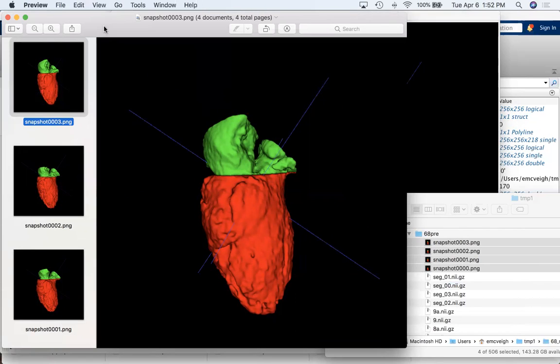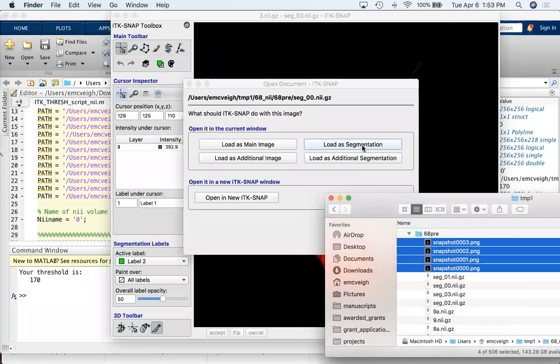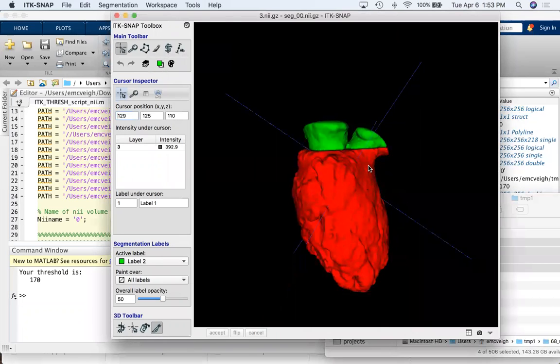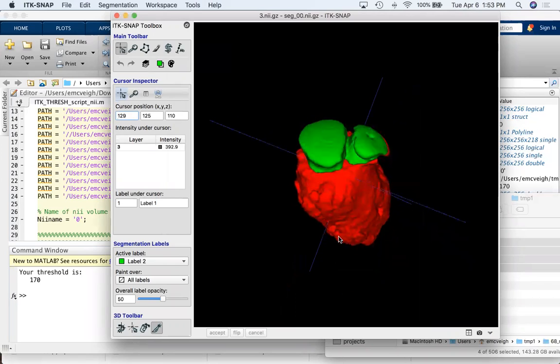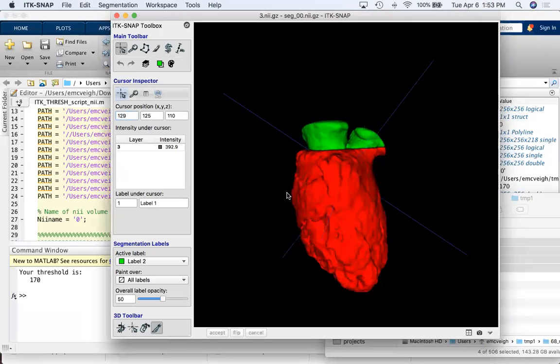So let's, oops, it's not the right application. So we're going to read 0 in again. Go to segmentation. Now we want to cut this thing off, right? And Gabby likes it to go from right where this groove is, start there and then cut down so that you cut the curvy part out. So about there.